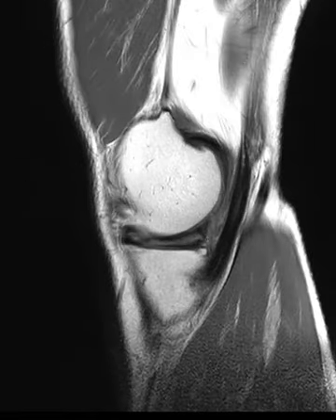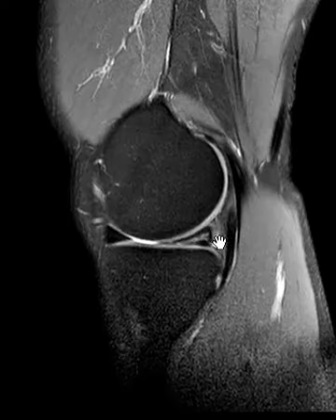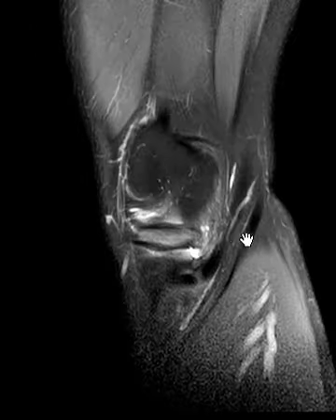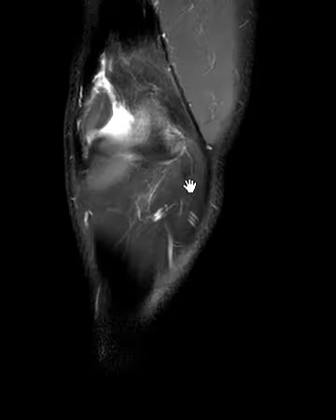And if we go to another view, we'll be able to see this a little bit better. On this view, fluid stands out as bright. And now we see this horizontal abnormal signal within the substance. We see that funny little cyst behind it. And if we get off to the body, the middle of the meniscus, we see this thing that's bright. We're going to put up a different view to see that better.